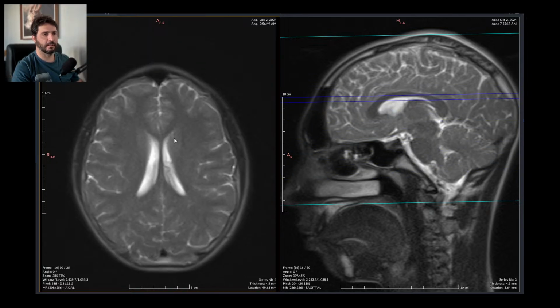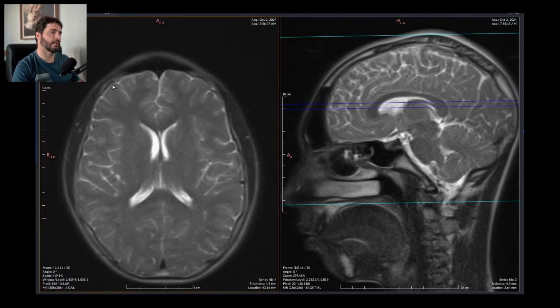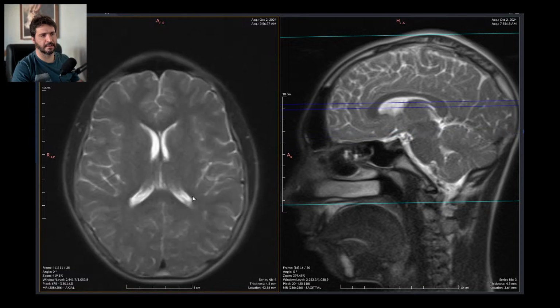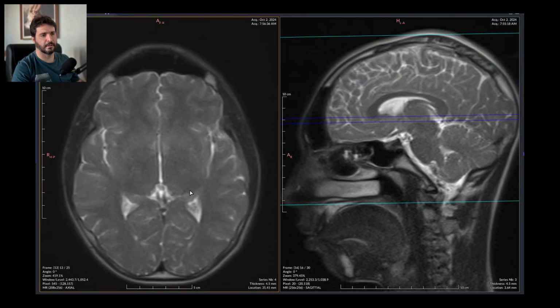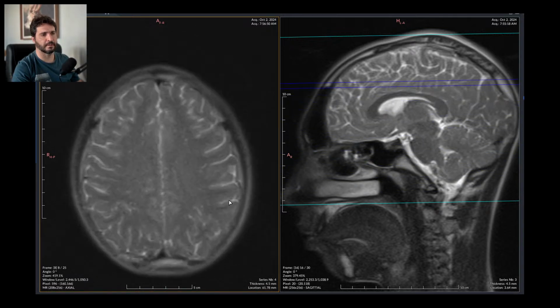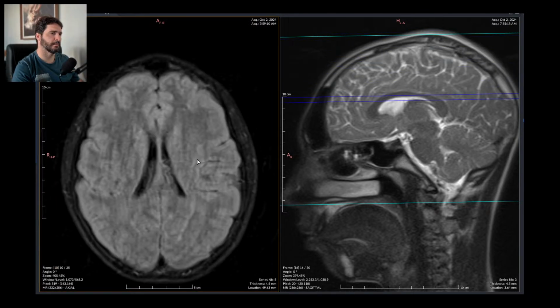See, when it's a low quality, low resolution scan just like this, both cortex and white matter look very similar in signal intensity, because it is what it is. There isn't much signal to draw a proper image. It's usually just make believe. This really isn't a proper exam for much.